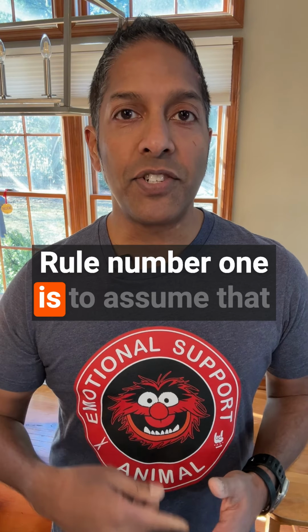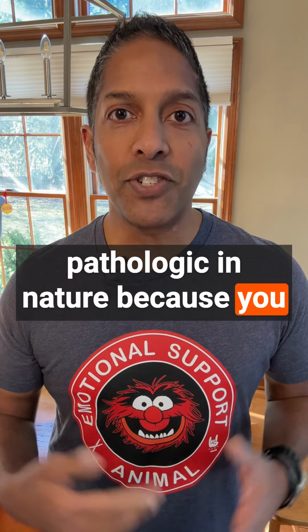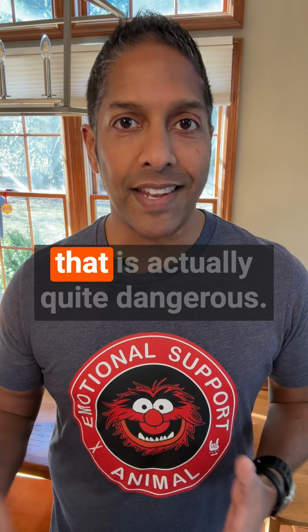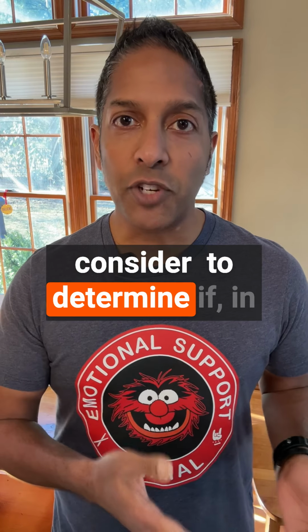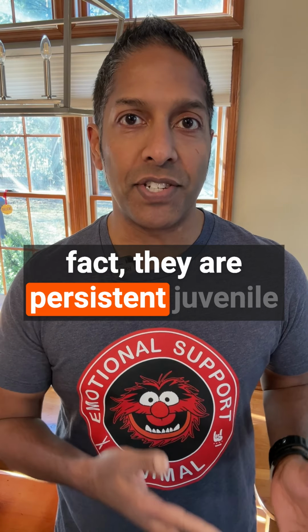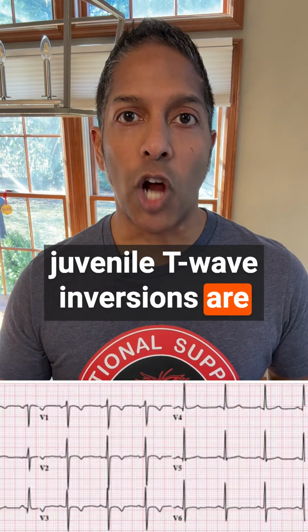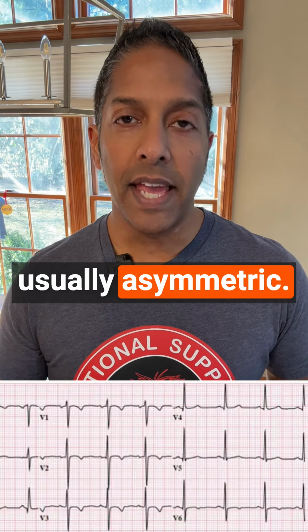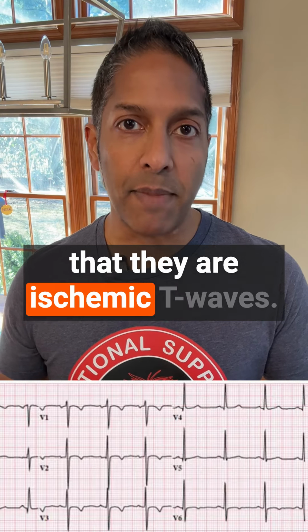Rule number one is to assume that those T-wave inversions are pathologic in nature because you don't want to call something benign that is actually quite dangerous. There are three tips that we can consider to determine if, in fact, they are persistent juvenile T-wave inversions. The first thing to look for is that juvenile T-wave inversions are usually asymmetric. If those T-wave inversions are symmetric, you should assume that they are ischemic T-waves.